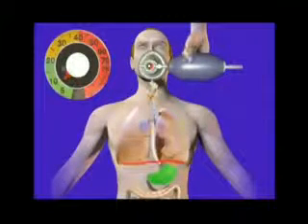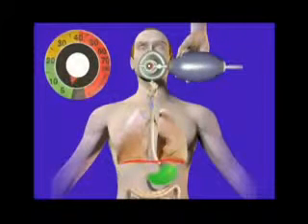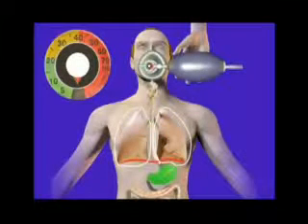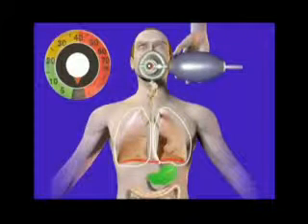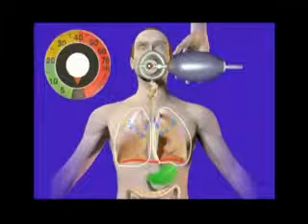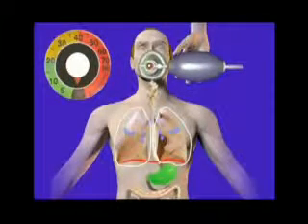Having an integrated pressure manometer on your resuscitation bag is an effective tool that allows caregivers to monitor and control delivered inspiratory pressures during manual resuscitation and ventilation. Monitoring and controlling airway pressures during manual ventilation minimizes the occurrence of life-threatening complications, leading to improved patient outcomes and greater survival rates.